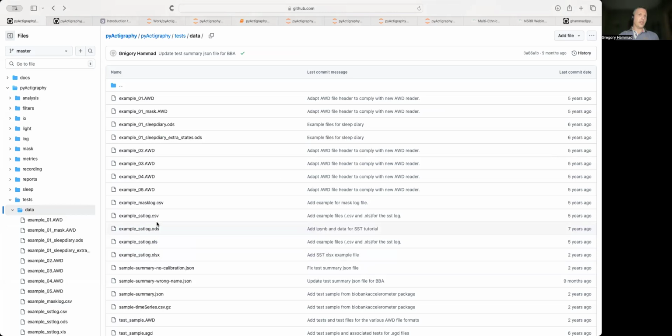There are different file formats that you can use: Excel formats, OpenOffice formats, and CSV. I always suggest CSV because there is no ambiguity, especially for the dates. If you use Excel, depending on how your computer is set up, whether you are in the US, Australia, or Italy, it might interpret the dates differently, and then if you save, it will also save with this modification. So if you have these Excel files, you can still read them, but I would recommend going for a CSV, which is unambiguous. It's just text. It is what you input.